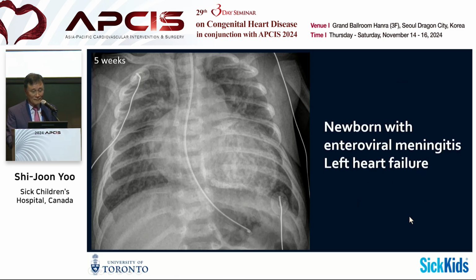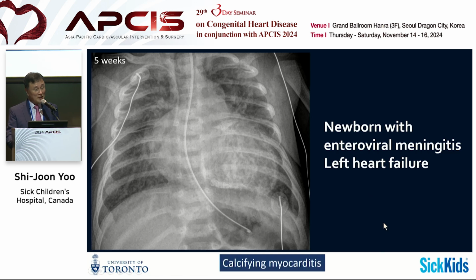Here is another one: a 5-week-old newborn with enteroviral meningitis and left heart failure. Do you see anything wrong? Here you can see some high signal intensity, a bright area, here too. This is very, very typical of myocardial calcification. So, calcifying myocarditis. We quite often see enteroviral infection with myocarditis having rapidly developing calcification.